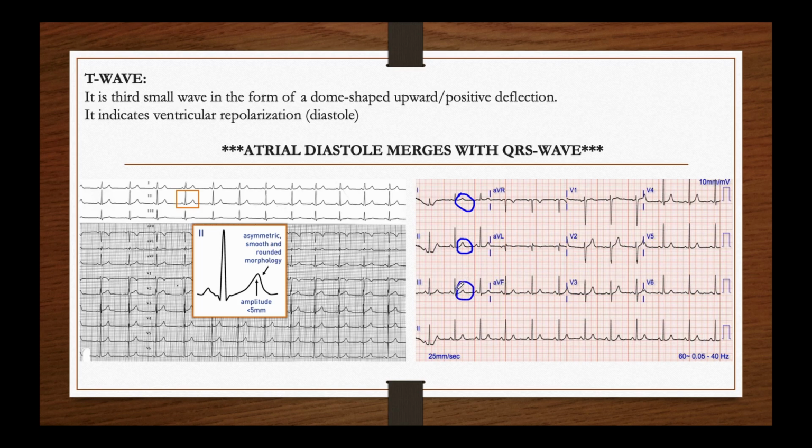This is also another T wave. But as I've indicated, the T wave is negative in augmented leads AVR as well as AVL. Another important thing that we must know is that the T wave is highest in precordial leads V2 and V3. And so if you find this in any ECG, it is normal. It is a normal amplitude of the T wave. This is not anything to cause alarm. So that is it with the T wave.